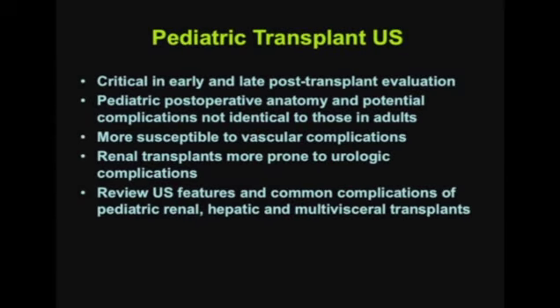Ultrasound is critical in the early and late post-transplant evaluation. Pediatric postoperative anatomy and potential complications are not identical to those in adults. Children are more susceptible to vascular complications, and renal transplants in children are more prone to urological complications. What I plan to do with you is to review the ultrasound features and common complications of pediatric renal, hepatic, and multivisceral transplants.